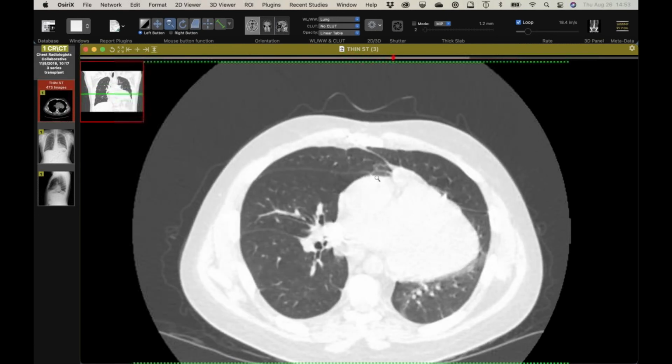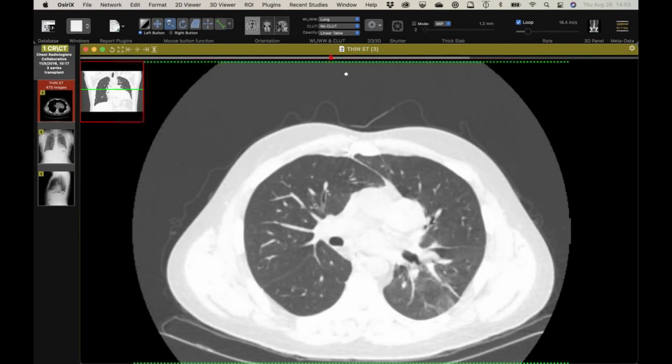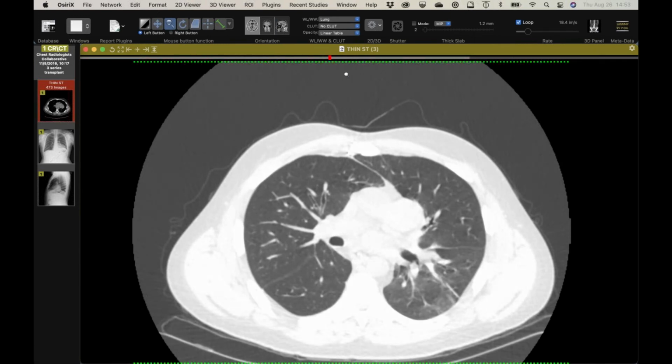I don't know, does anyone, David, you've probably seen some of these in the past. I've not seen that many heart-lungs, so I'm trying to figure it out. He doesn't really have the usual anterior junction line because he doesn't have parietal pleura. Normally the anterior junction line is 4 layers of pleura. He only has 2, and he also probably doesn't have his sternopericardial ligaments intact. So that's why this heart is flopping around.